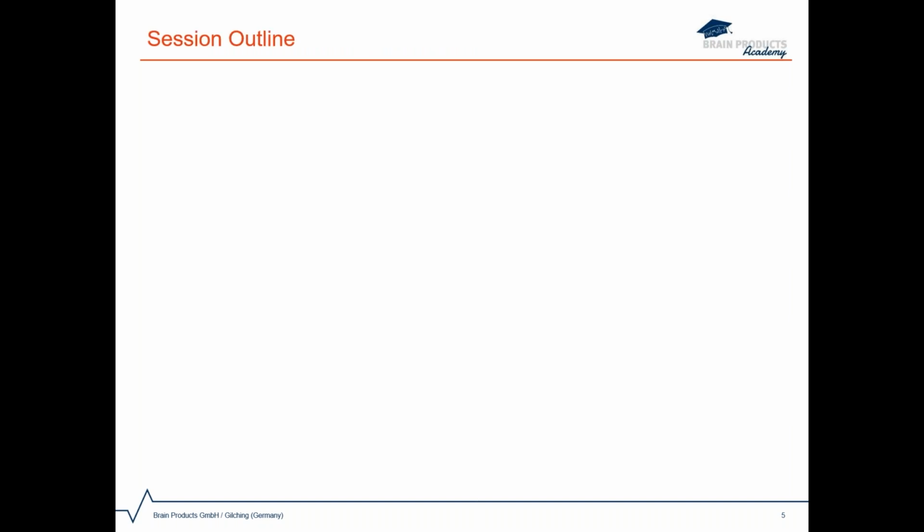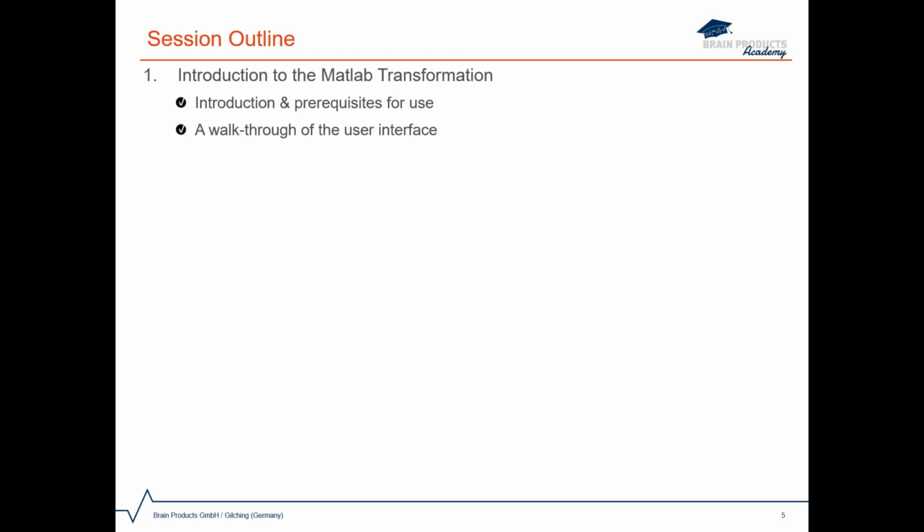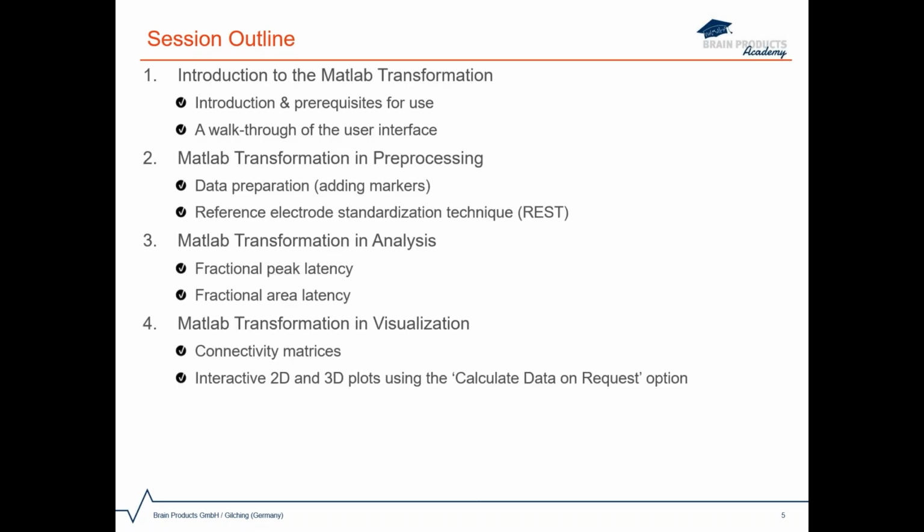Now, let's take a look at the contents for today's session. As a starting point, I will give an introduction to the Matlab transformation. This entails informing you about the prerequisites for using it. After that, I will walk you through the user interface page by page. Next, I will demonstrate how we can make use of the transformation for pre-processing, analysis, and visualization purposes. In each session, there will be 2 exemplary use cases.